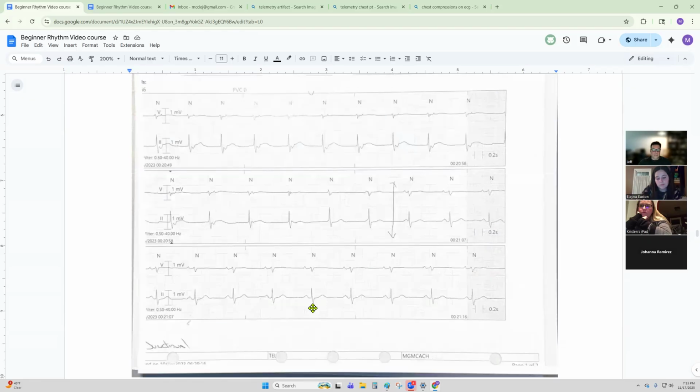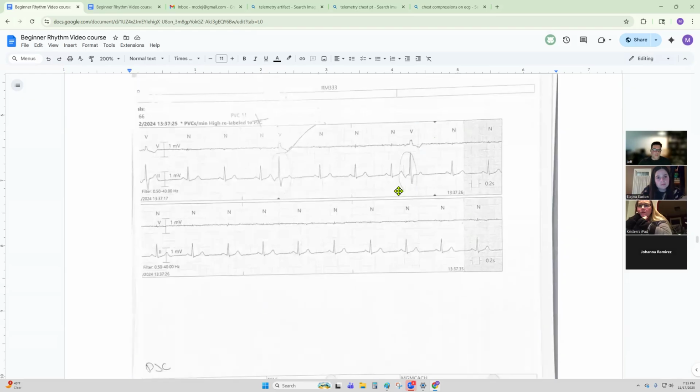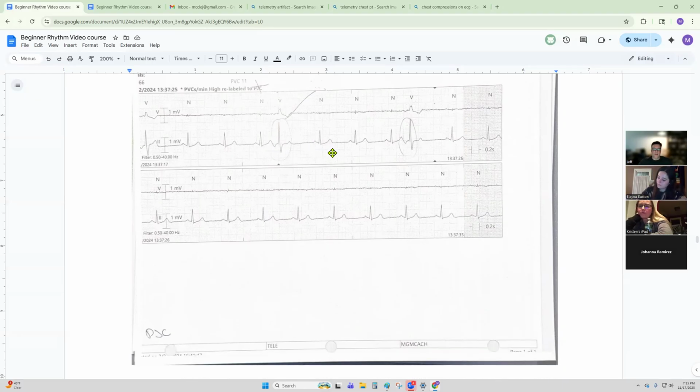This one above, the P wave is retrograde. You see the negative P wave right there, just after the QRS complex in lead 2. And of course, you have PJCs. This one, the QRS looks a little bit different just because it acquired a bundle branch block, but you still have that negative P wave right there. And it's early. You get a compensatory pause after the fact.